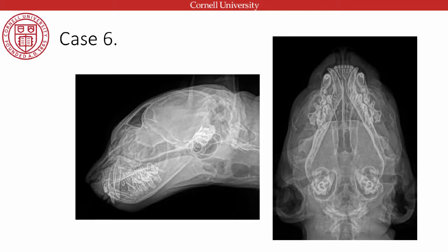So then we've got to start thinking down the road, okay, we do have a multi-fracture case here, but we also have a diffusely osteopenic patient. What do we want to be asking the owners? Yeah, exactly. So do we have a nutritional hyperparathyroidism going on here?